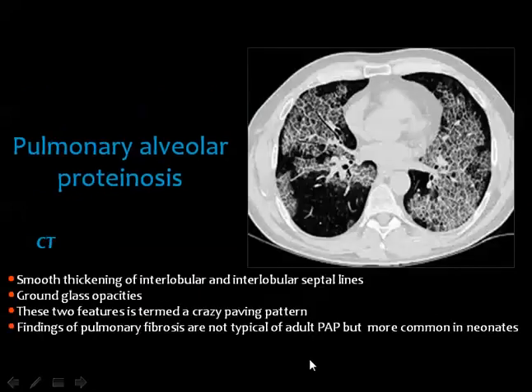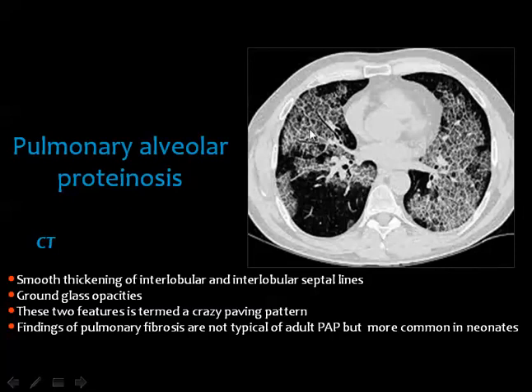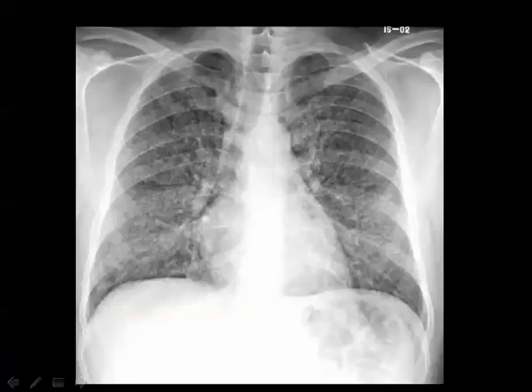But if you have the CT scan and you see this classic appearance, which is known as the crazy paving opacities, these opacities are hexagonal opacities representing the pulmonary lobule with the central ground glass area, and typically you should see parts of uninvolved lung. You see areas of involved lung and areas of non-involved lung, and this is known as the crazy paving.